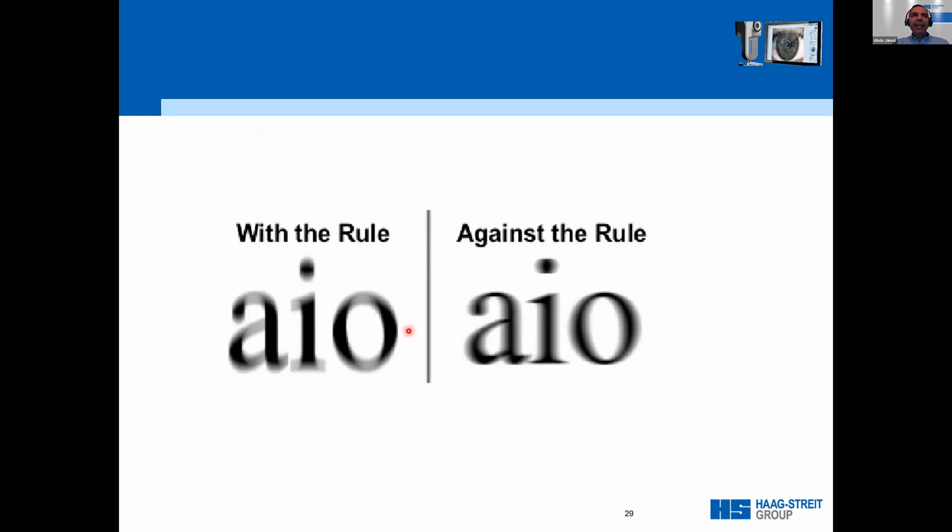So the brain needs time to adapt from this image to this image. Since the overcorrection is usually minor, I don't think it will be a big issue here. But it's always the surgeon's decision to do this or not.